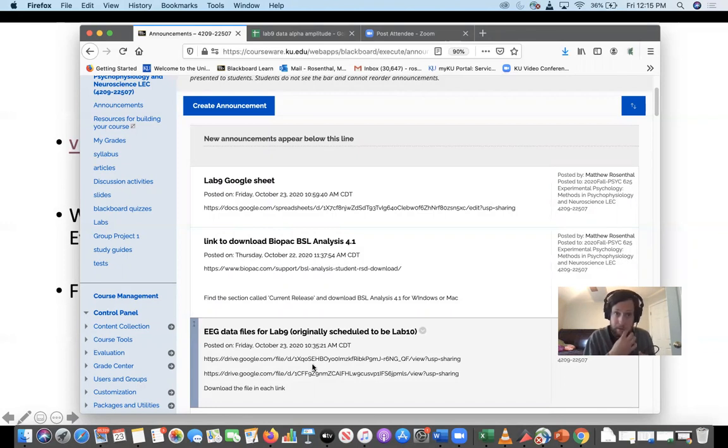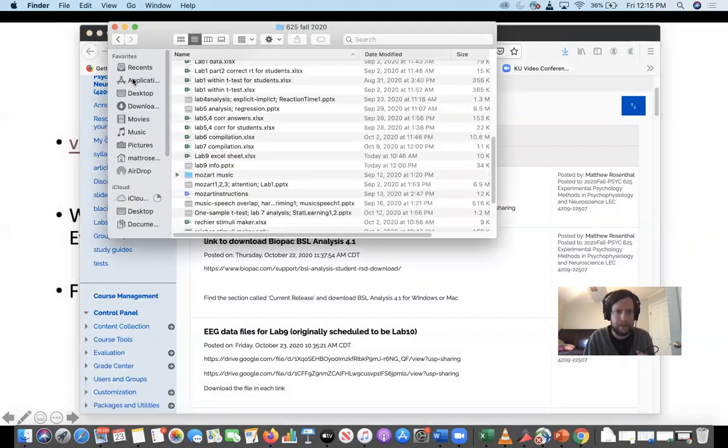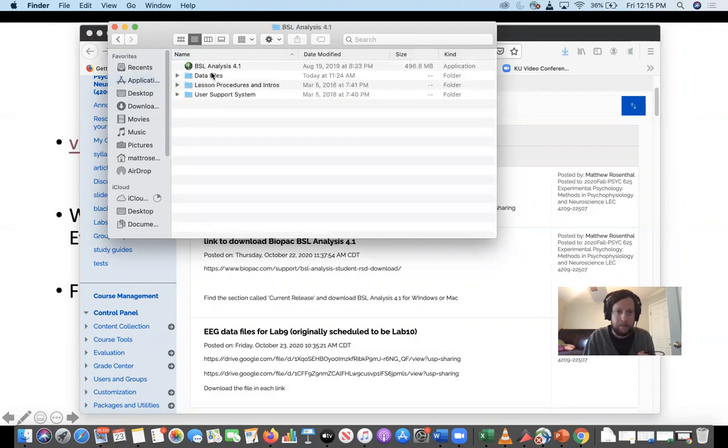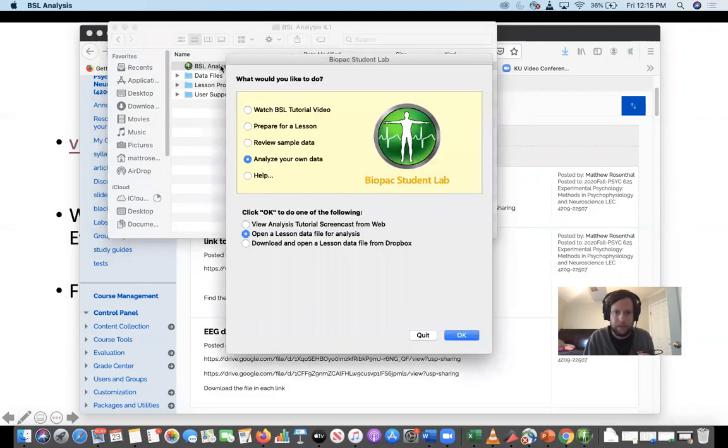So now I will show you how to open up Biopac. For me, I just have to go to my applications, BSL Analysis 4.1. This is what I've been referring to as Biopac, but it's really called BSL Analysis 4.1. The company that makes it is Biopac. Click on the folder for me, and then this green icon right here, BSL Analysis 4.1. Double click, and you want it to look something like this.